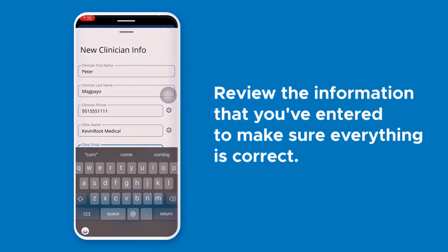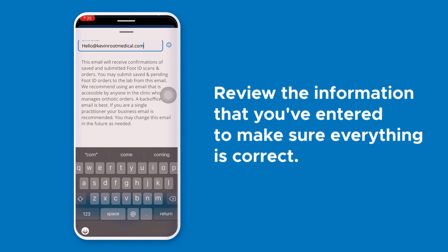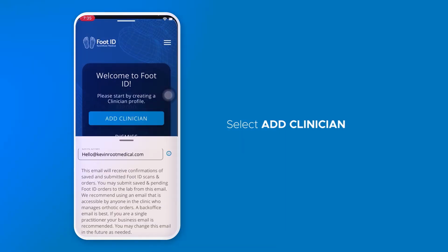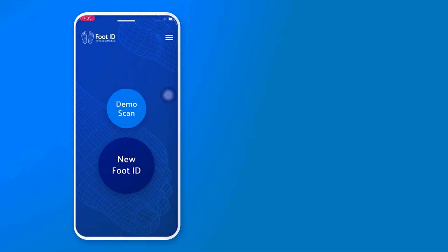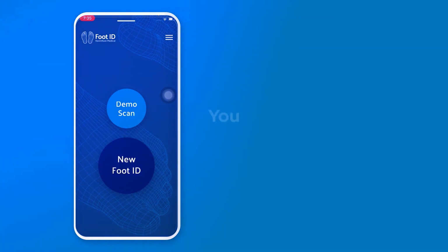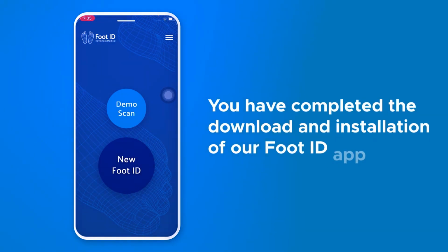Review the information that you entered and double check to make sure everything is correct. Then go ahead and select Add Clinician. Once that's completed, you'll see the home screen for Foot ID as well as Demo Scan and New Foot ID. At this point, you've completed the download and installation of our Foot ID app onto your iPhone or iPad.